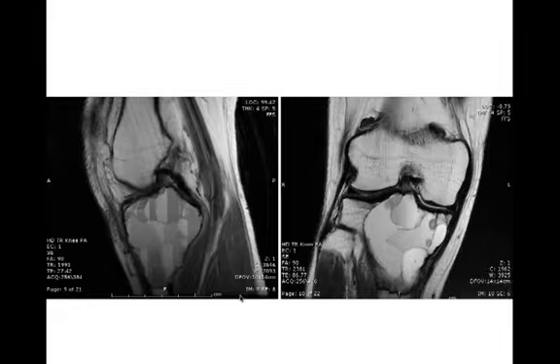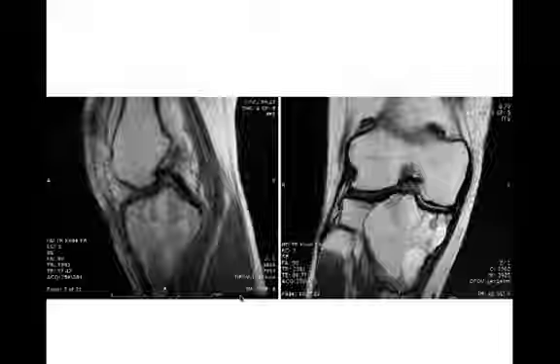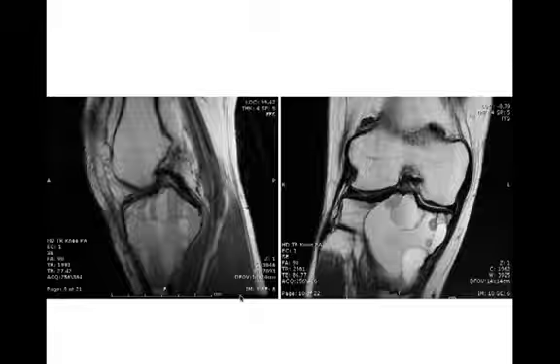This was a giant cell tumor, and giant cell tumors are one of the things that will give you fluid levels on an MRI. Other things that will give you a fluid level will be aneurysmal bone cyst, chondroblastoma, and a telangiectatic osteosarcoma. They'll also give you fluid levels on MR.